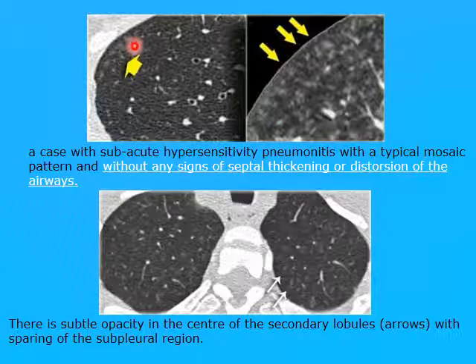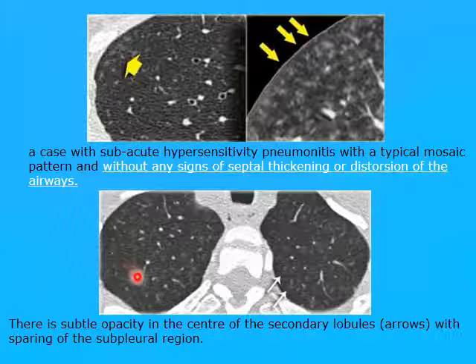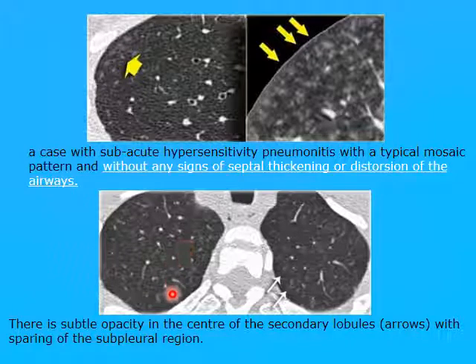Okay, and for these are faint ground glass centrilobular nodules. Do you remember? Centrilobular nodules should be away from the pleural surface by 1 to 1.5 centimeters. Look again, we have very faint ground glass opacities involving the centrilobular areas. You can miss this if you are not that experienced in CT chest, and if you didn't do MIP and MinIP, because they help a lot to detect these fine or faint or subtle centrilobular opacities.